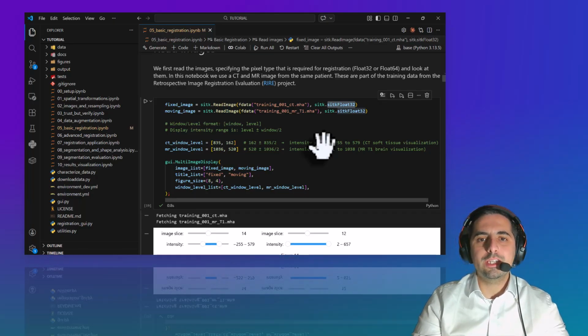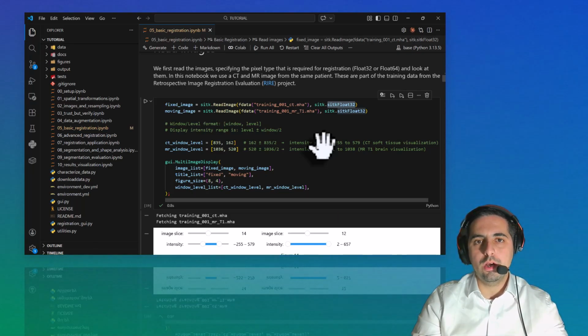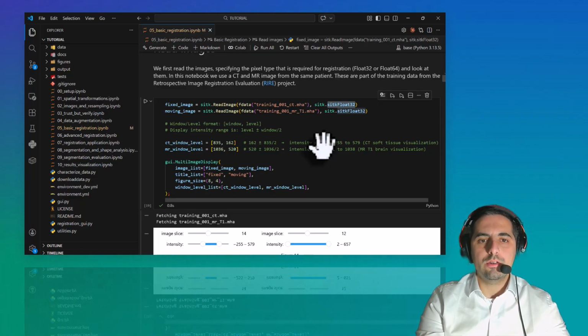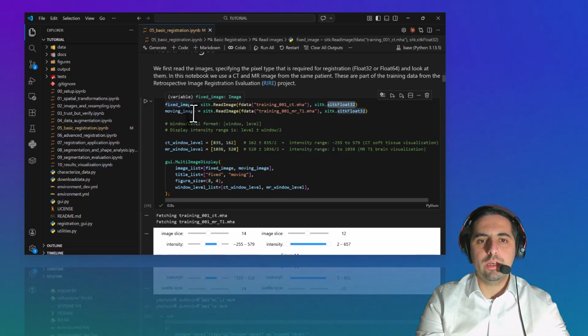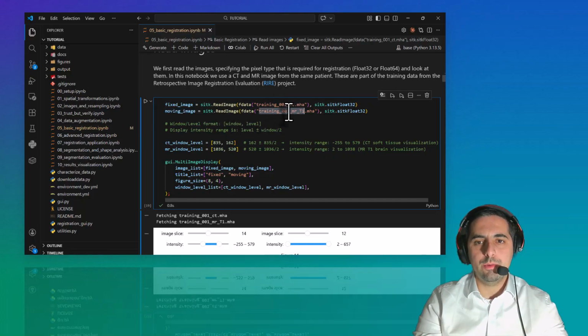We can also explain the rotation matrix by the Euler angles, so we just need 3 elements of the Euler angle: pitch, roll, and yaw. So let's go ahead with the fixed image and the moving image. We need first to choose our two inputs. So we need two volumes, one from the CT, one from the MRI.